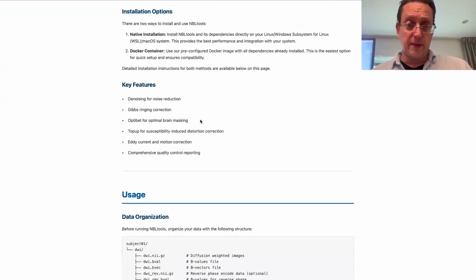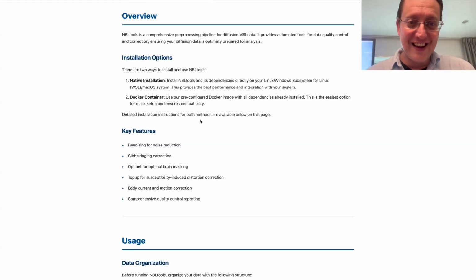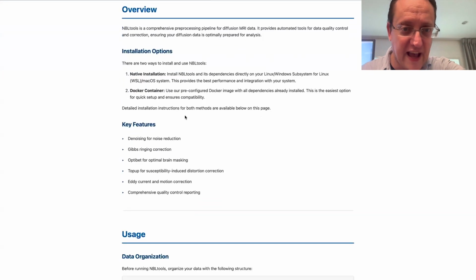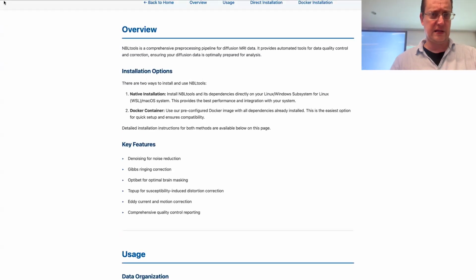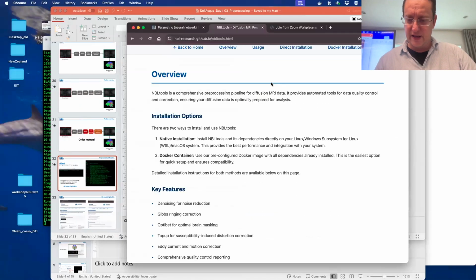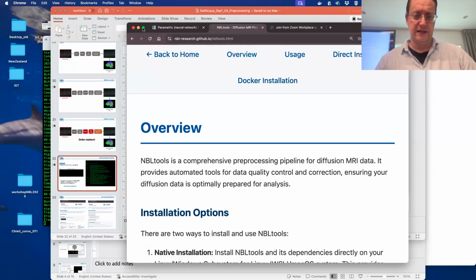So this, for example, let me see. I wrote the page. I already forgot what I wrote. Let me see what I'm saying here. Yeah, as I say, can you see? Can I get it bigger? Sorry. Just a second. Let me try to get the. Okay, now a little bit bigger so we can see better.